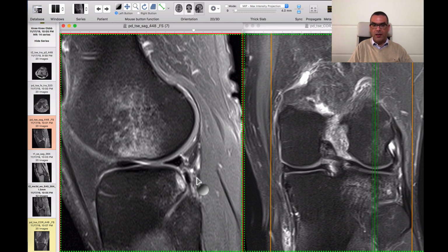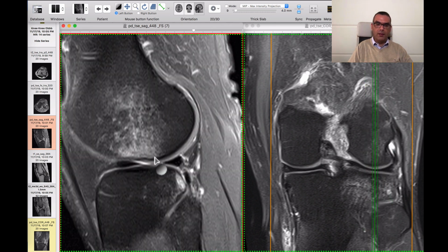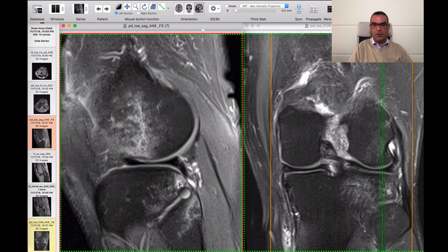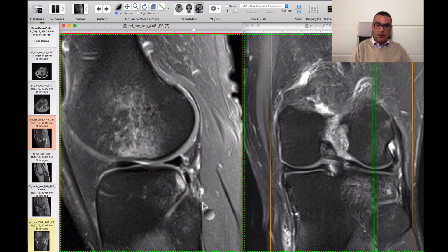They are both intact, and you can see here, of course, the marrow contusion at the lateral femoral condyle and the opposing one at the posterolateral corner of the tibial plateau, as well as the fibular head. So this is very typical, guys. This is very, very typical pathology you see with ACL rupture, and these are the secondary signs of ACL rupture.